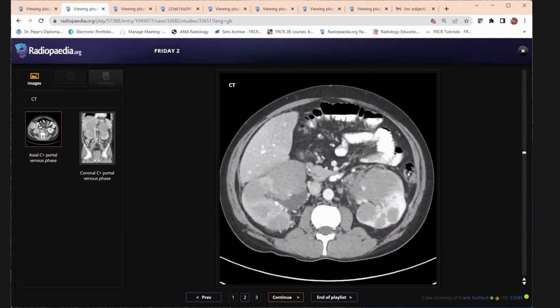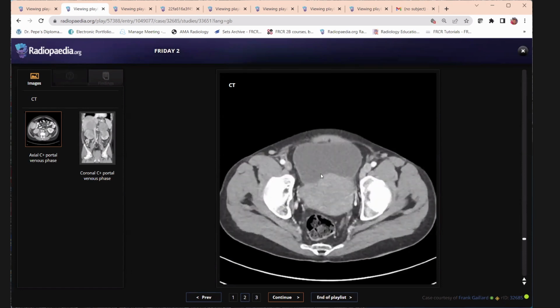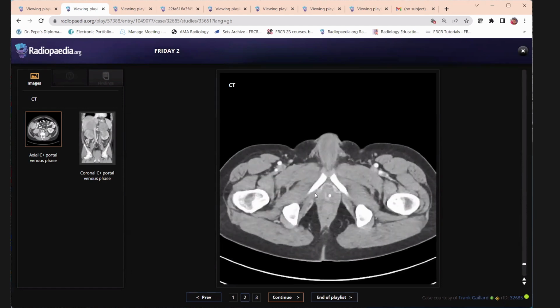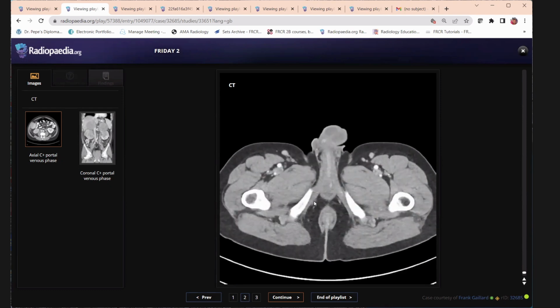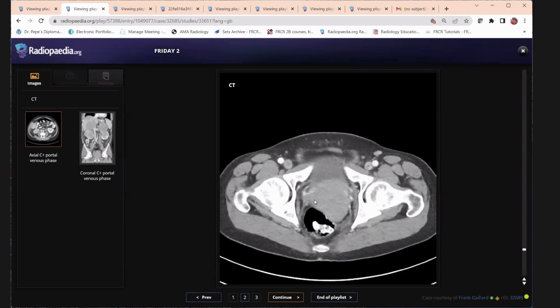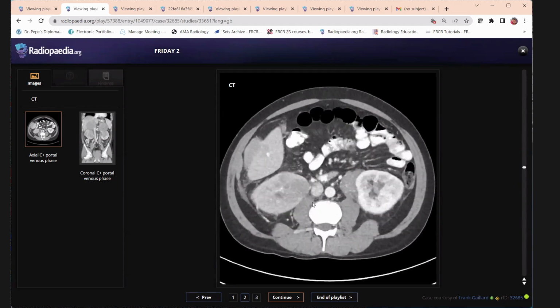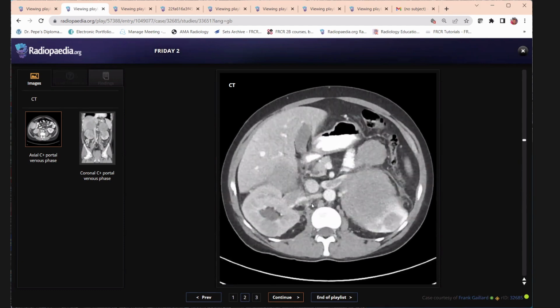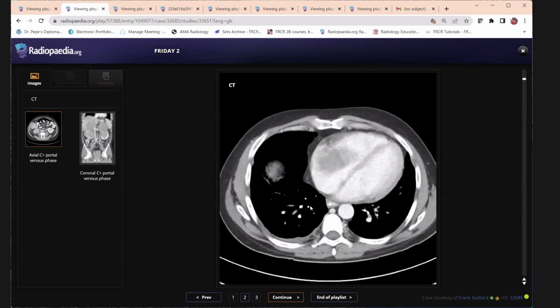Okay. And first, I wanted you to scroll down because I wanted you to pick up this. And then the second time you told me that it is a uterine, although I asked you to scroll till the bottom. So keep in mind whether it is a male or a female before saying that, because that will cost you, fine? And you picked up the pulmonary embolism, that is good.